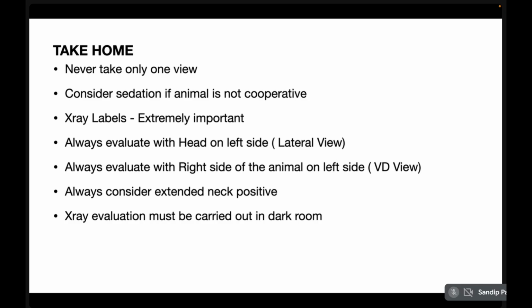Positive as a position. We already saw how it looked very different. And X-ray evaluation must be carried out in a dark room.